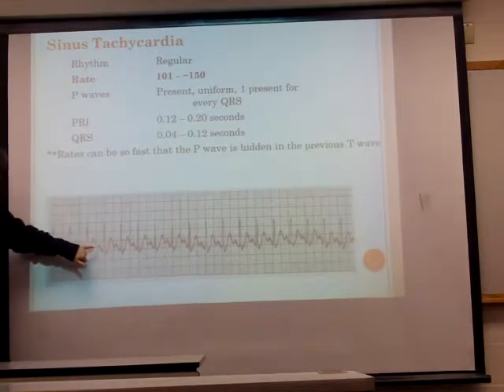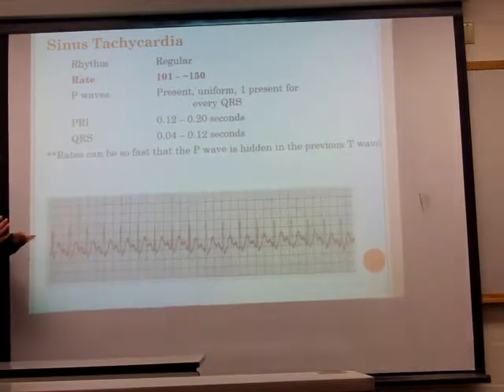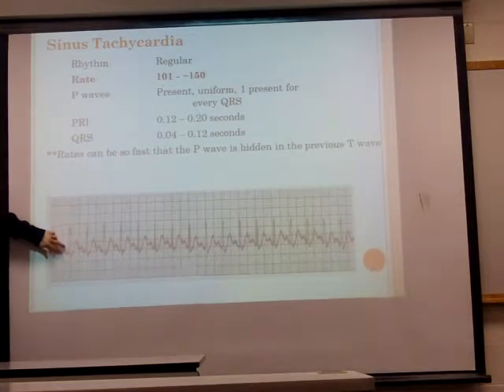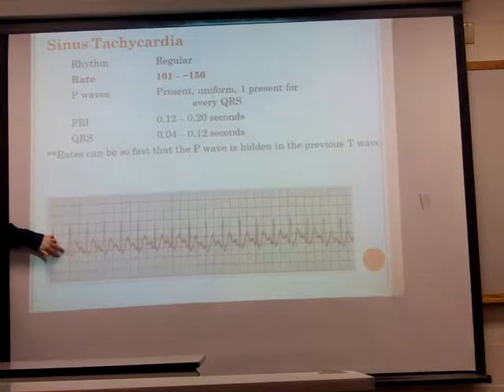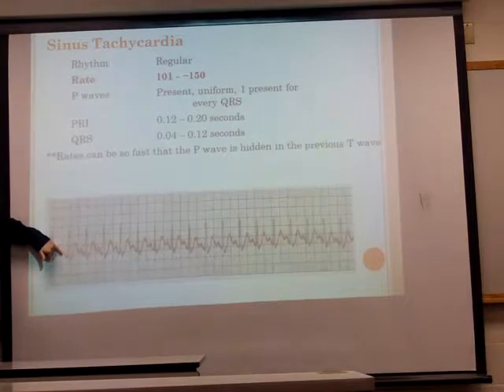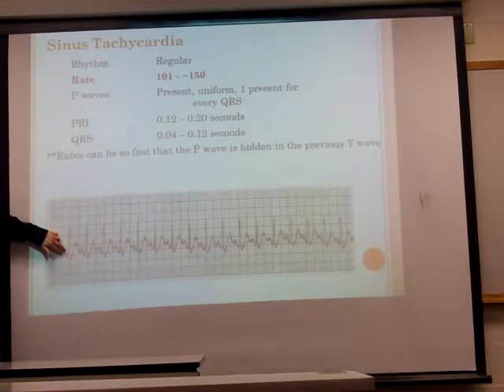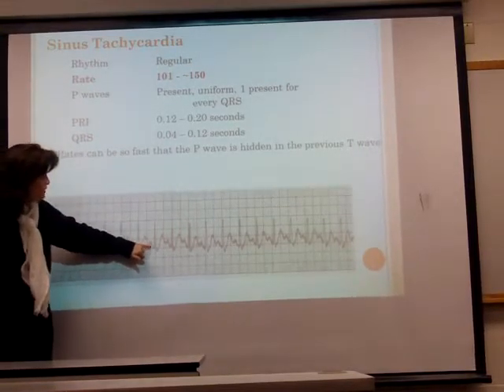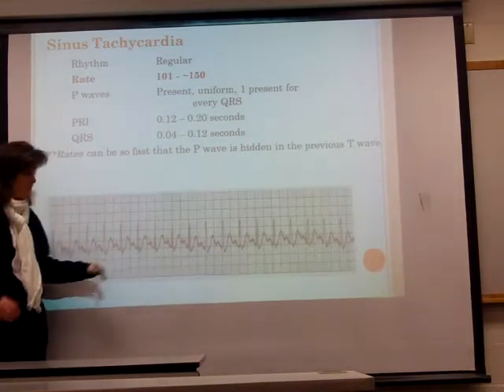But here we can clearly see that there's a P wave. So we start at the left and we notice it's not peaked. It makes it a little more difficult to see because you've got to kind of turn your calipers a little bit sideways to get the true measurement of the amplitude of that P wave. So you don't want to measure from here to here because that's not fair. It's picked that isoelectric line up because it's marching up inside the T wave. So that's about 2.5 millimeters, so borderline, but it's not peaked. But there is a P wave before every QRS, okay? Now, if you told me that P wave was peaked, wouldn't necessarily be wrong, all right?